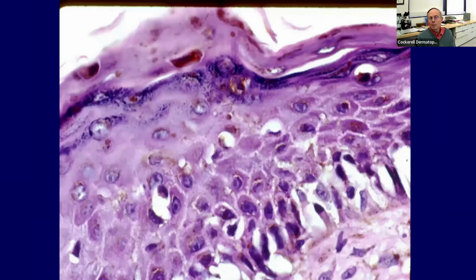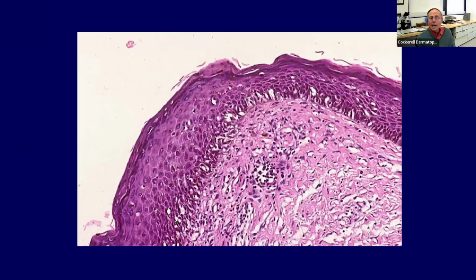Now, this is another feature that we see very frequently. We get a biopsy, and if you look at a high magnification, say, gosh, there are all these melanocytes here at the junction. There's some pagetoid spread. Gosh, it sure looks like melanoma. Go back to lower magnification. Again, you see these nests of melanocytes that sort of coalesce at the dermatoepidermal junction, but notice the effacement of the epidermal rete here. And there's also some fibroplasia in the papillary dermis.